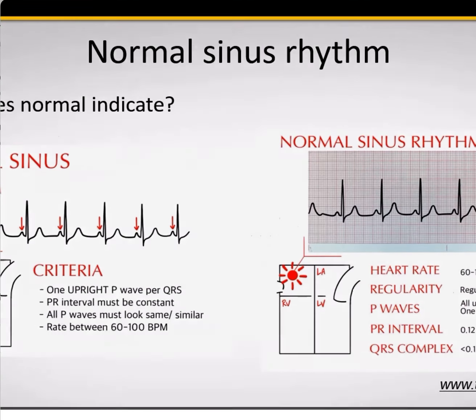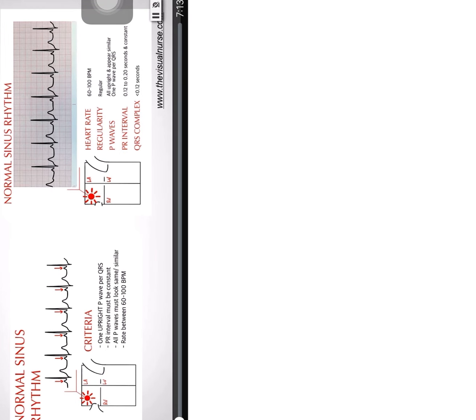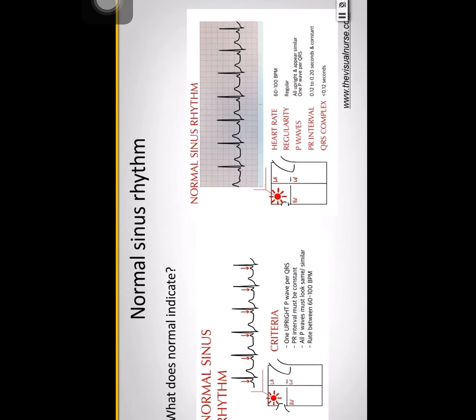So now that we've covered an overview of the sinus family of rhythms, we can go ahead and take a look at our first actual cardiac rhythm here. So normal sinus rhythm. All right. What is normal sinus rhythm?